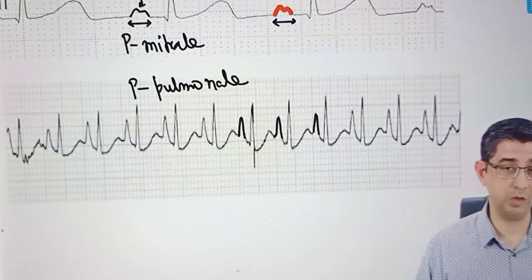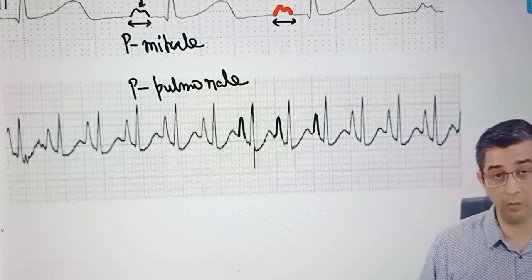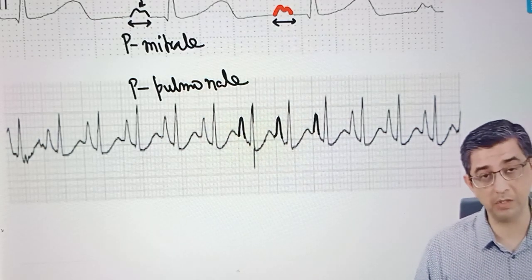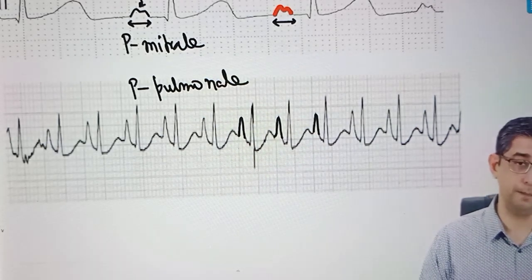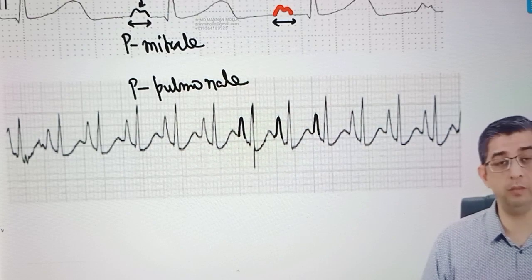And following the P wave, always check out whether QRS complex is present or not. Because if it is present, it is normal sinus rhythm. If not, then there could be a possibility of heart blocks occurring in a person. I'll describe the heart block subsequently when I talk about the PR interval. Because coming up next is PR. Either PR can be short, therefore there could be tachycardias in a patient. If PR is prolonged, there would be bradyarrhythmias occurring in a person.